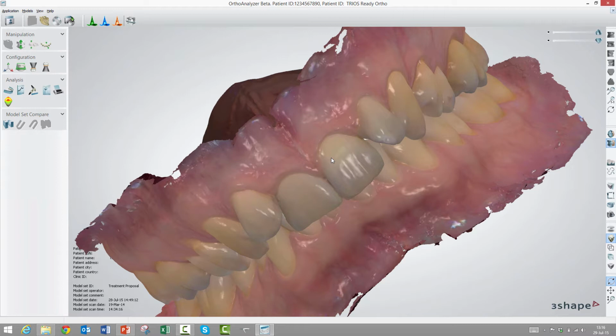So there are ways that you can configure how the right button works. And I'll get right to the first couple of tools here in the visualization toolbar here. As you can see, the very lower end here, I have 3 ways to operate the right side of the mouse. The first thing here is what we call rotate view. The second thing is what we call pan view. And the third thing here is what we call zoom view. Rotate view is default. That's what I've just been demonstrating.